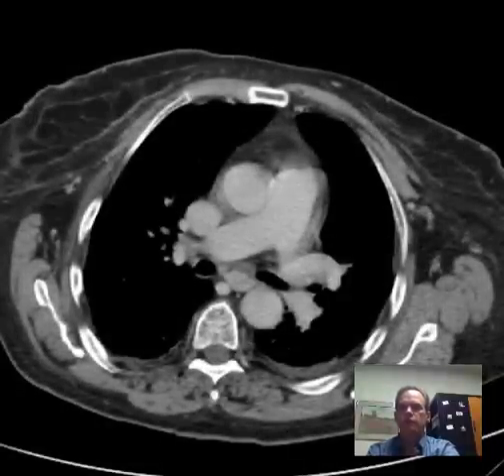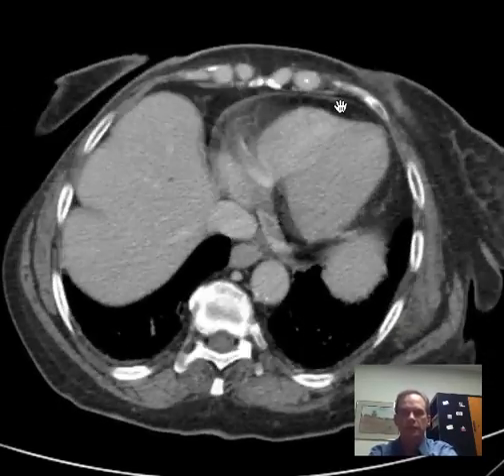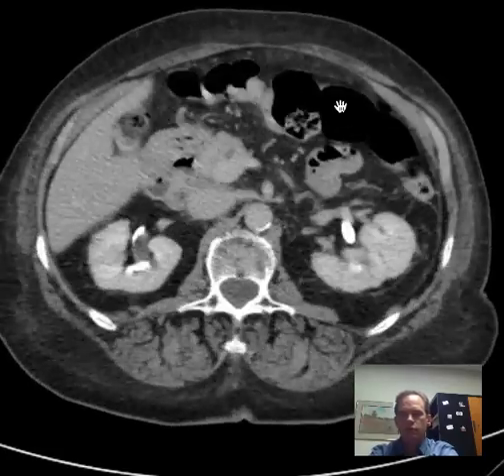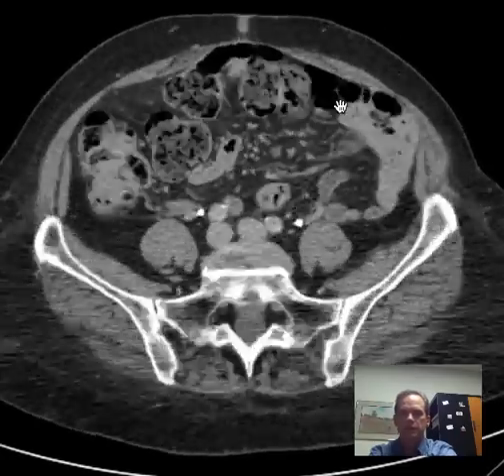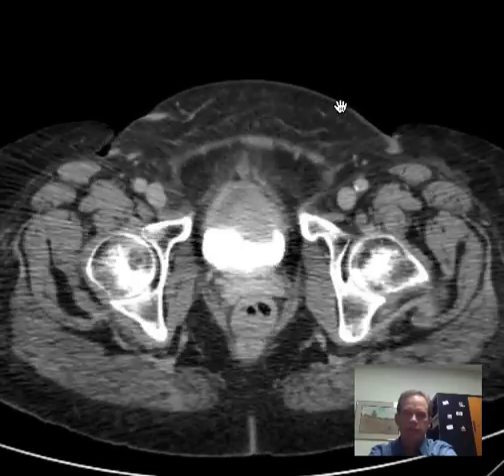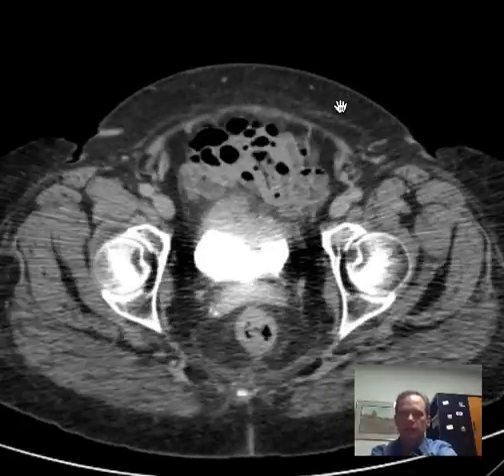Now this is an altogether different type of process, and let's see if you can see what the abnormality here is. So we'll go through it as I always do, just looking carefully for anything that might catch my eye. Alright, it's nice to give a case like this a quick going over before you jump into one area.